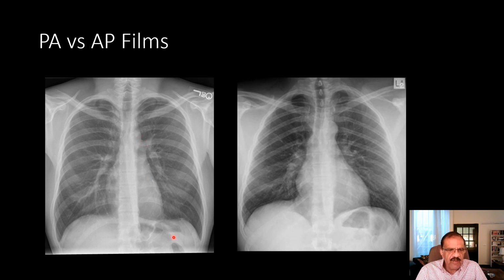So when it comes to the heart, you are actually interested in three things. One, the position of the heart. This is the normal position. Two-thirds of the heart is on the left side and one-third is on the right side from the imaginary midline. If you draw a line here, two-thirds of the heart will be on the left side and one-third will be on the right side on this one also. There are actually exceptions, but this is the general rule.